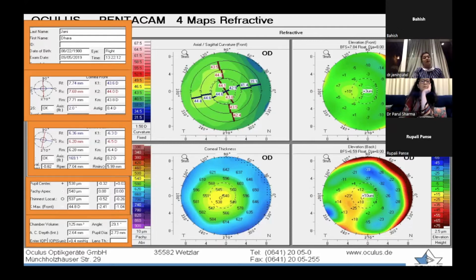Coming to the elevation based parameter of the Pentacam, and understanding what elevation based system is.